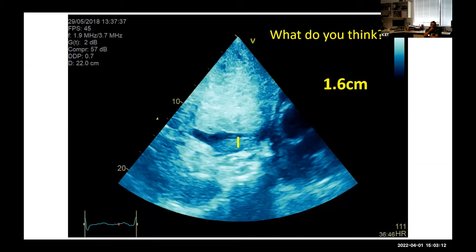So where would the pericardial effusion come from in that context? Okay. So what's your conclusion? The conclusion is that this woman is very unwell and she should probably have her pericardial effusion drained. It will be a large pericardial effusion with specific features of tamponade. Okay, sure. So go on to the postscript.